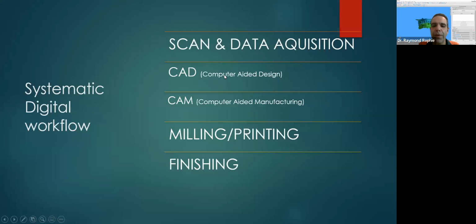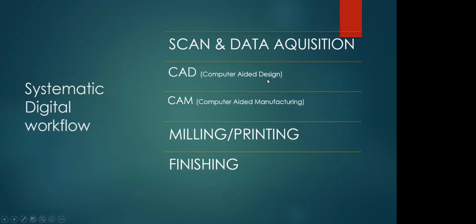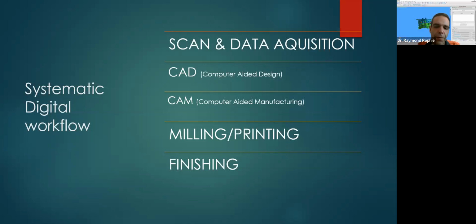So that will be the data acquisition. From there, we have as well the design. In this webinar, we will design, number one, the implant position, which will be at the end of the surgical guide, but will be completely prosthetically driven.